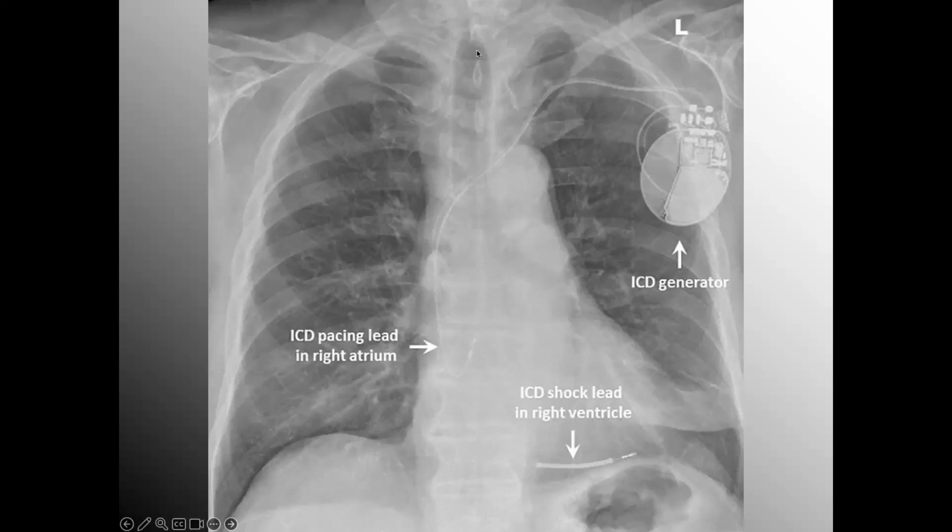But staying with our system of ABCDE, A for airway and adenopathy, B for bone, C for cardiac, D diaphragm, and E everything else, my airway fairly midline, slightly offset towards the right. Here's my adult carina, and I don't see any adenopathy here. I do see some vascular markings and what probably is a little bit of what's known as bronchial cuffing here. That's when you've got edematous bronchi that sort of show up like a little donut.